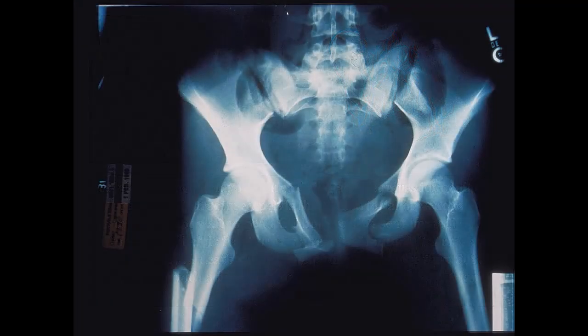Take a moment to visualize what type of structures would be compromised by the jagged edges severing the soft tissue and vasculature. You have to be able to understand what is contained in this area that we do not see because we're looking at bone.